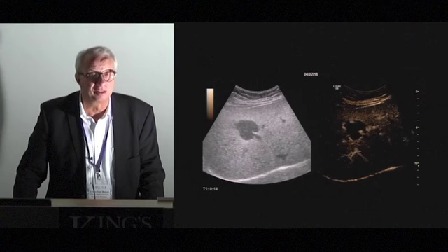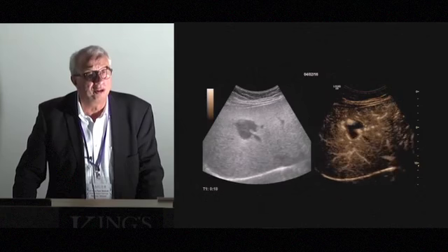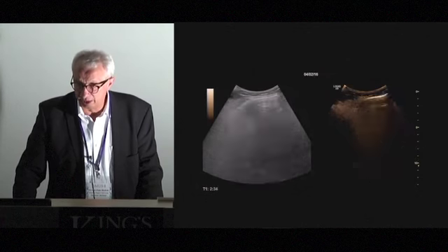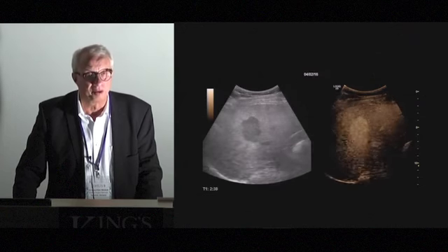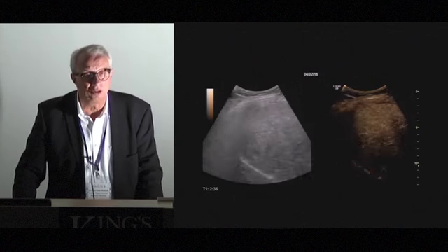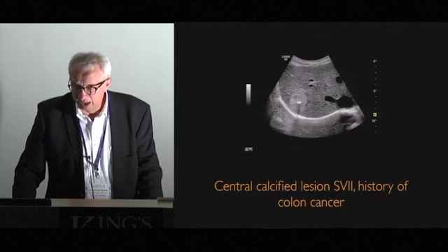And of course, in contrast, surprise, this is a typical hemangioma with a peripheral nodular enhancement. And when we look later, nearly completely filled. So there's no discussion about that. You don't need any other imaging modality. You don't need biopsy, nothing. So that's it. Diagnosis confirmed.